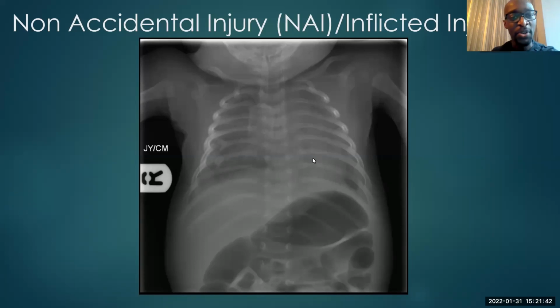To give you a bit more history with this particular child before I go on to the next image, the lungs are very abnormal, hey? Unfortunately, this was a post-mortem study for a child who was definitely abused and the parents were convicted. It's quite a sad story, but we wanted to do a post-mortem study and it was in the name of research that was done with the permission of the parents.